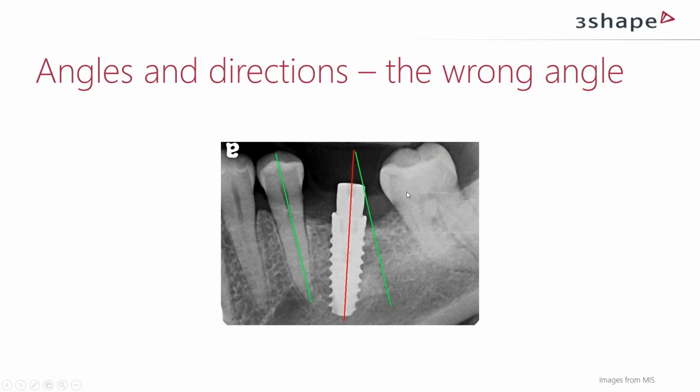Is this due to the problem to navigate in the mouth? Because when we open up a flap in this area, we think that the angulation of the jaw is actually different, so you have to compensate for that when you do surgery. An experienced surgeon knows this, but if it's the 5th or 10th implant, you are still a bit nervous and you focus on placing the implant in the middle, but you miss the angle of the actual teeth. It can also be a case of a punch technique where you do it flapless, so you didn't see where the other roots were underneath the tissue.